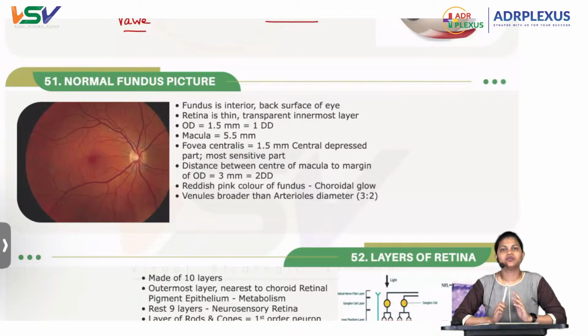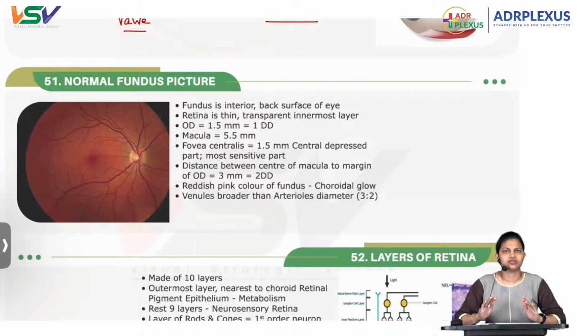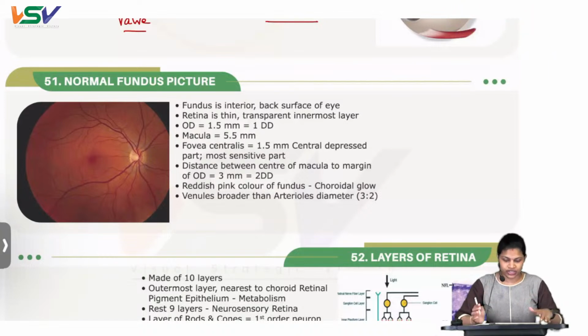Okay, the other one will be an OCT. Most of the pictures would be like this, a fundus retinal picture, as you can see in 51, and subsequently we'll see the OCT picture also. I will tell you the significance and how to go about it when there are images. Also, subsequently we'll revise the points.